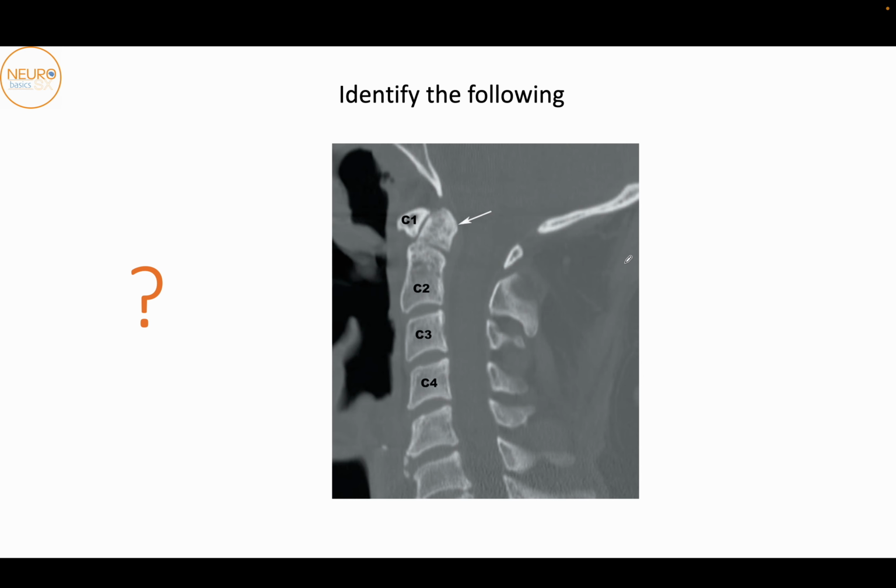Right. So can you identify this anomaly in a patient who is 16 years old?